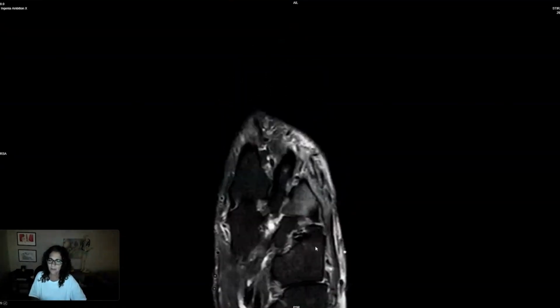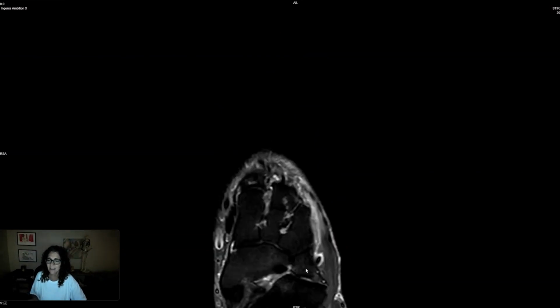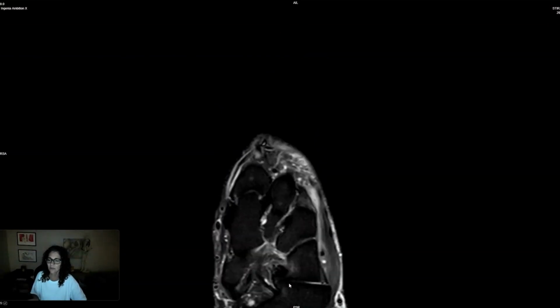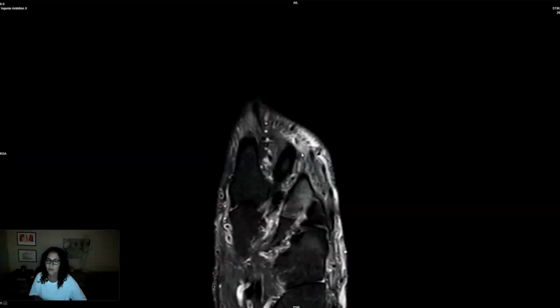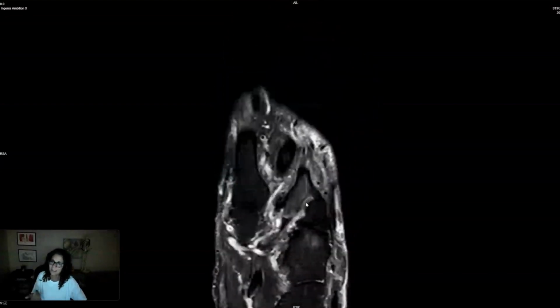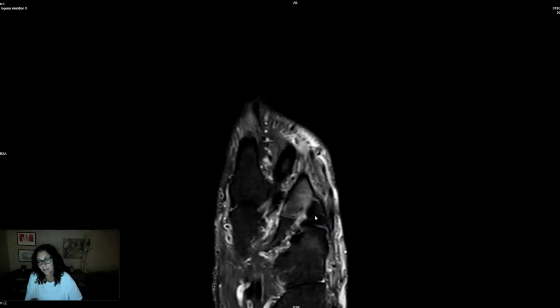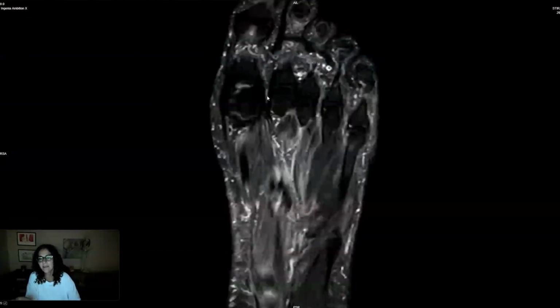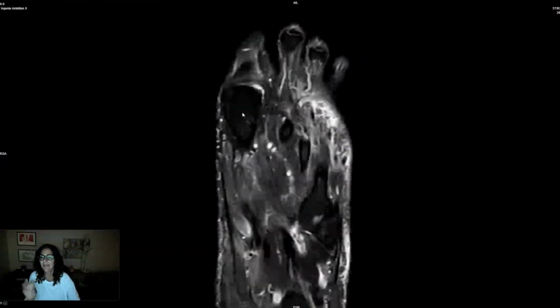Let's keep going. I'm also seeing some degree of changes at this central area of the anterior subtalar joint where they all line up, which may mean that the vector of my foot goes through this region as part of their weight bearing. So I'm considering this as biomechanical right now. So when I do think about erosions in the foot, obviously I'm going to go to the hallux MTP and try to convince myself, because I don't know that many people who have gout that doesn't affect the hallux MTP, but would only affect here.